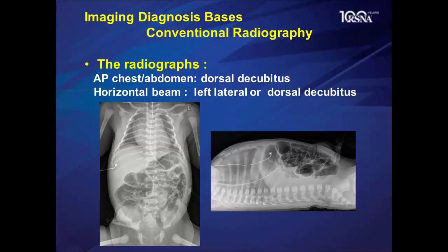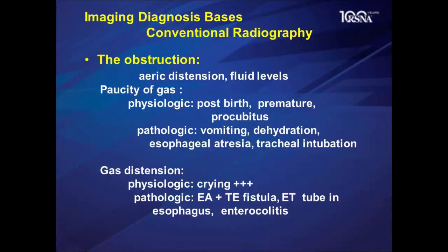And you notice that abdomen radiographs are first obtained with a chest radiograph, because the GI tract actually starts above, from the mouth, even from the choanal zone, nasopharynx, and then builds up to the possibility of esophageal problems. And then our main concern is in the intestinal tract. Then we will find out where the obstruction is.